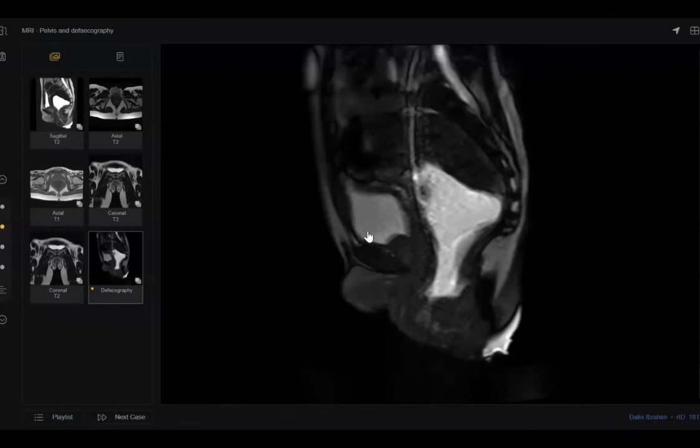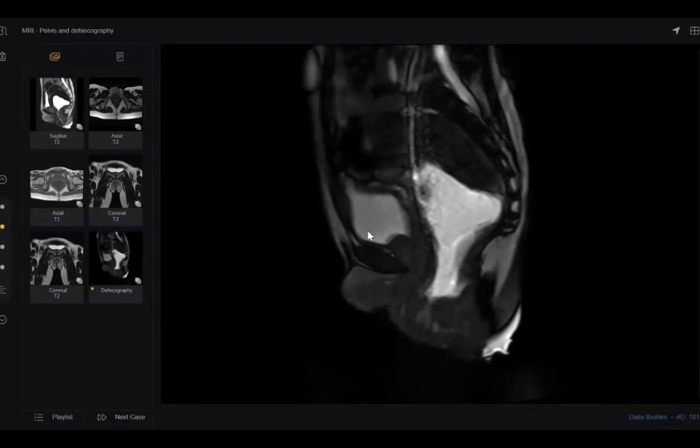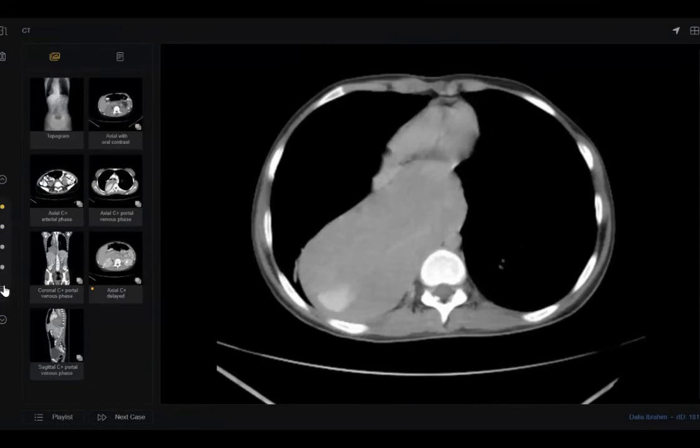Okay, so in this patient who is presenting with dysphagia and a dilated rectosigmoid and dilated rectum, I can see that there is a benign type of circumferential long segment thickening involving the anal canal. What's your final diagnosis? So this is collectively in keeping with multiple leiomyomas affecting the esophagus and the anal canal.